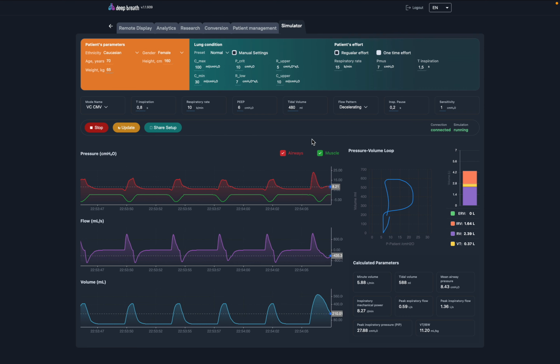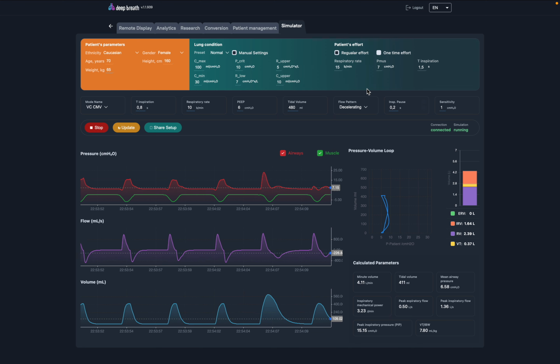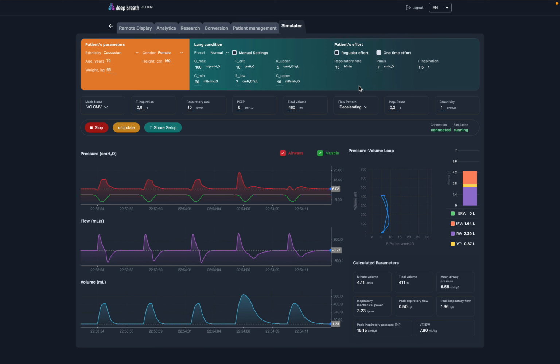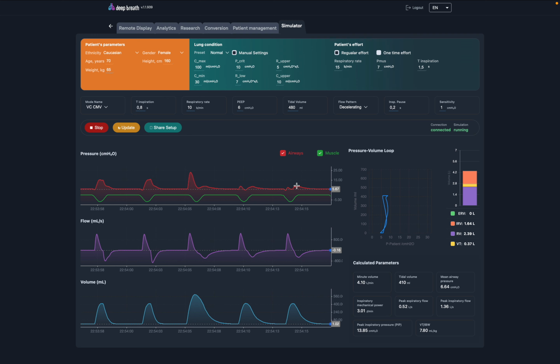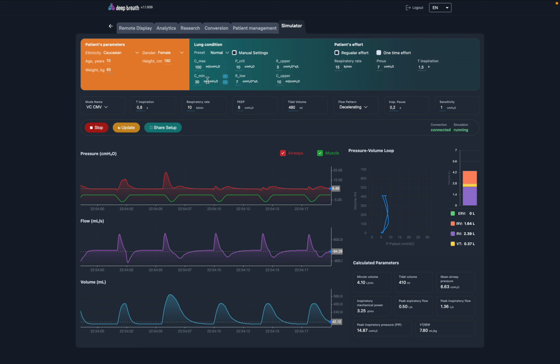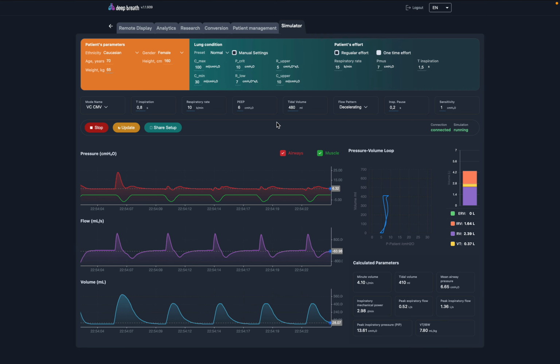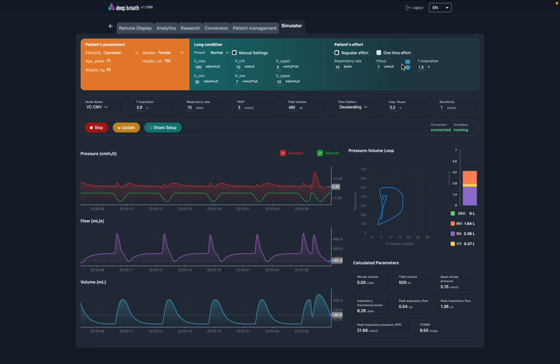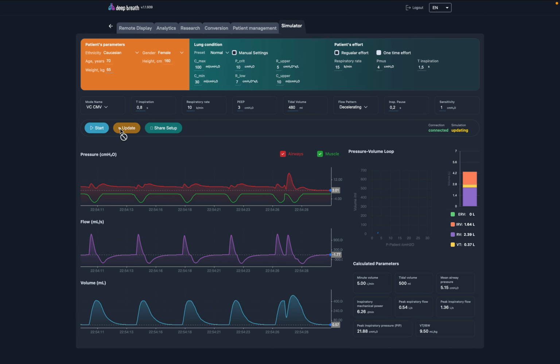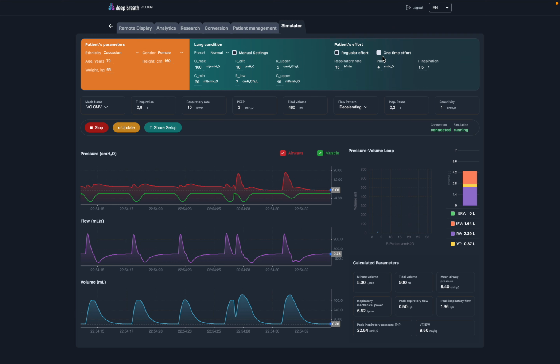So it's also possible to validate, verify. Yeah, one more. So we see severe flow starvation in this case. So something not very good, I guess. Yeah. What else? One more functionality.